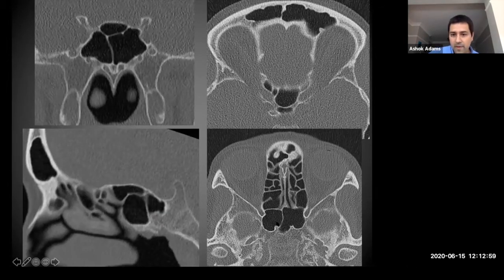When I move further back, you have the posterior ethmoidal air cells here. You can see the sphenoid sinus nicely aerated, looking forward, and in this patient, they've got a nicely aerated sphenoidal recess. Here you've got a little variant. We have different classifications. I still call them Onodi air cells, but really these are posterior ethmoidal air cells that can run above the sphenoid. So we'll always forewarn the surgeon whether I think there's an Onodi variant and its relationship to the sphenoid, particularly to the optic nerve canals.